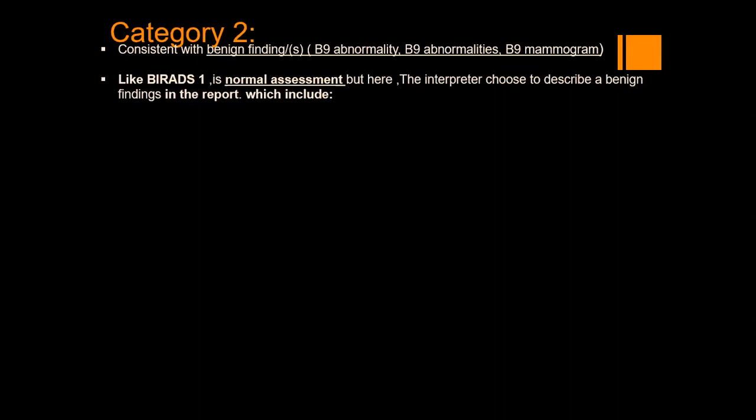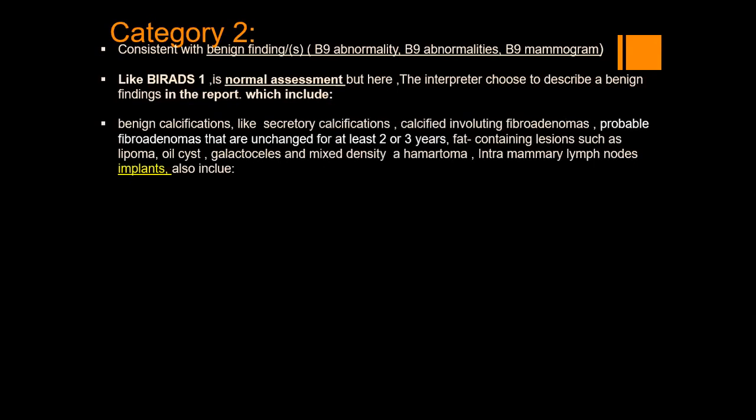What else? We have a lot of cases; you want to go quickly. Follow-up of the breast after breast conservative surgery. Excellent. But you have to ensure it is due to this intervention or these conservative interventional changes. Excellent, well done.